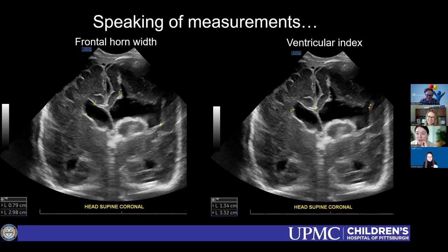This is where measuring is so hard. I hate measuring. Why? There are moments, and I will be the first to admit that in these cases, I will say significant interval enlargement. Because sometimes I think the measurements can actually be really confusing, because you can make it measure whatever you want it to. Yeah.